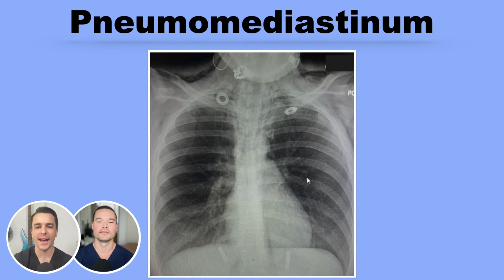So when we're looking at this chest x-ray, there's a ton of different findings here, but some of the most prominent are going to be our pneumopericardium, which is this air right here along the pericardium. We also see this paravertebral linear lucency kind of streaking upward, which again is clueing us into this pneumomediastinum. We also see the paratracheal lucencies, which again is air along the trachea.